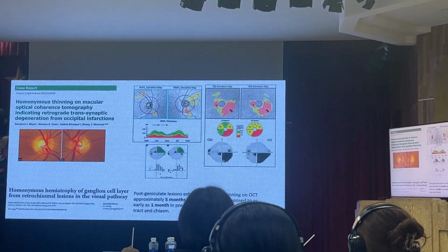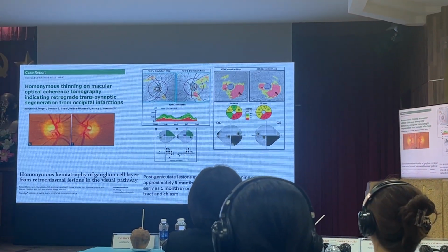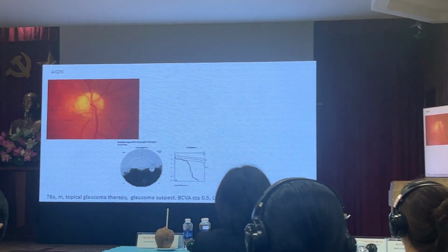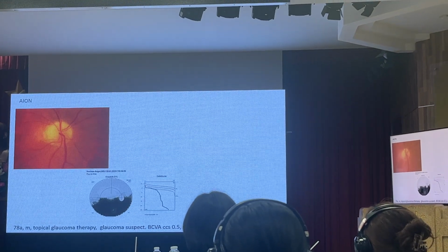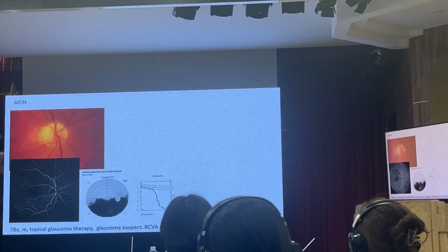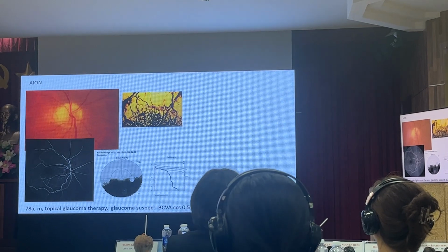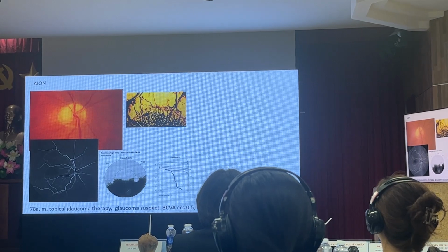If you have an atrophy behind the globe, with the damage behind the globe as the reason for the atrophy, it's already after 1 month that you see this atrophy. This is a patient with anterior ischemic optic neuropathy with the typical failure in the upper hemifield of the optic disc with the visual field defect in the lower hemifield. In OCT, with the normal fluorescein angiography, you see the dark area of the non-perfused area of the optic disc. And this reminds us of the Zinn-Haller vascular circle, which has the upper and the lower circle part.